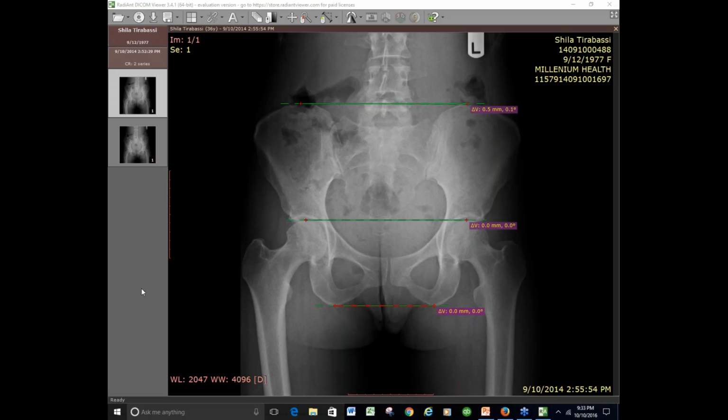Okay. My question is, this is in case they bring you a CD, but what if it's an actual film? Yes. You need to do some calculations. That's where your math comes in. You actually need to measure the distance between these 2 points, right?